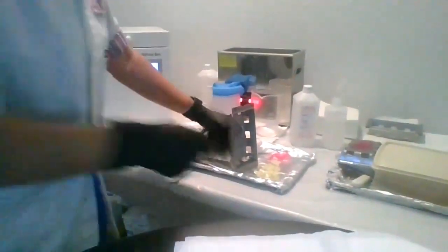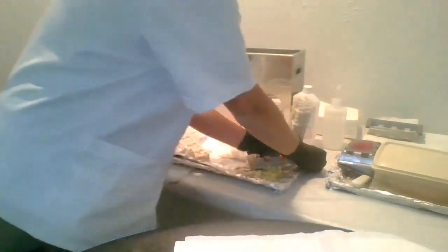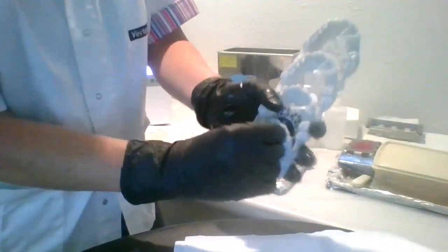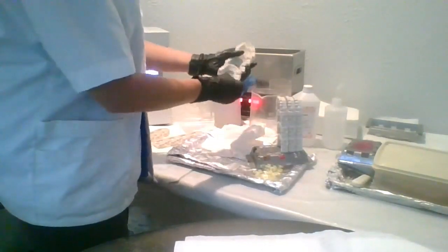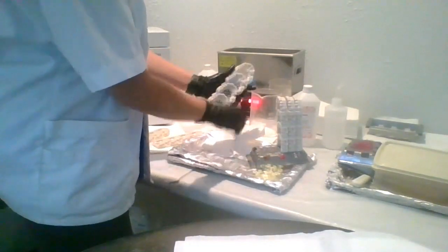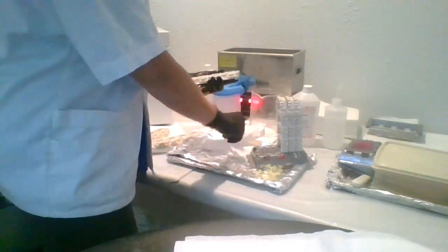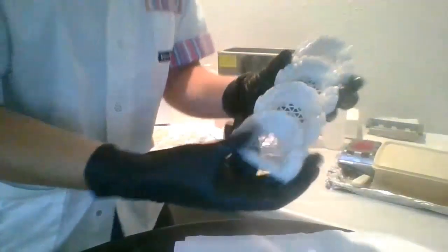Okay, here we go. So you're just going to punch those out, and that's the first thing that you're going to do. Then when you're doing this, just make sure that you pull off the lingual supports as well. I'm just going to leave these here right now. I always pull these off right when I'm done pulling them off of the build platform. I want to take these off right away because I don't want them to begin curing in my alcohol bath. I just don't want them exposed to much light. Anything that's real light or translucent, I find that I get much better results if I just wipe them right off, and there's no scarring at all here.